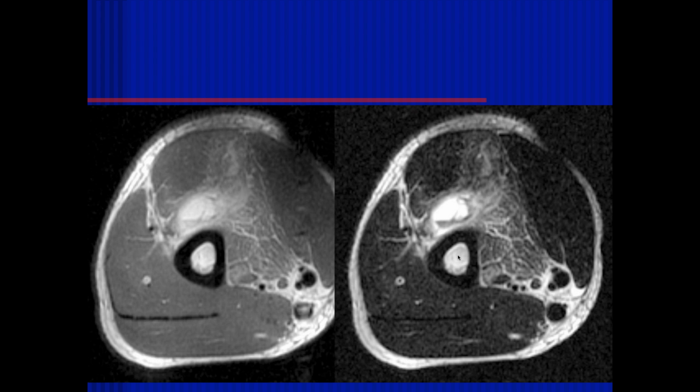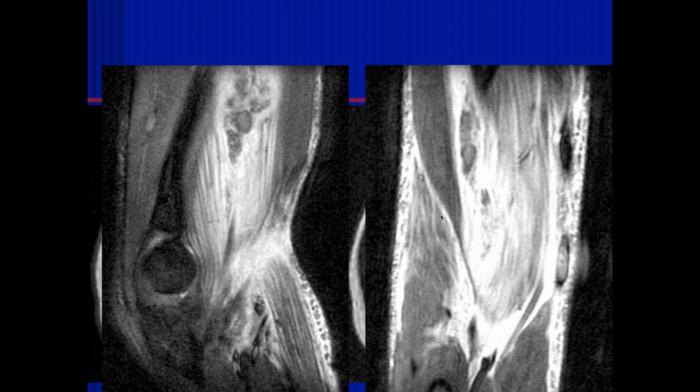Okay. Michael, what do you think? Or Ashley, what do you think of this one? So here, let's see, I can't really see it. One second, sorry. So is this the brachialis again? Is there fluid within the brachialis? Looks like at least a grade 2 muscle strain, and there's a fluid level. There might be some hemorrhage there. Yeah, and this is another brachialis tear, more severe, with focal areas of hemorrhage and fluid in it, compatible with a grade 2 tear.